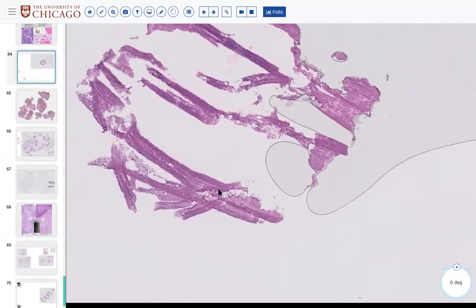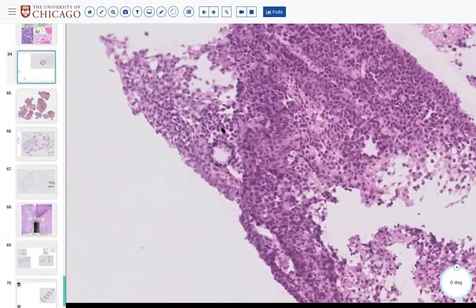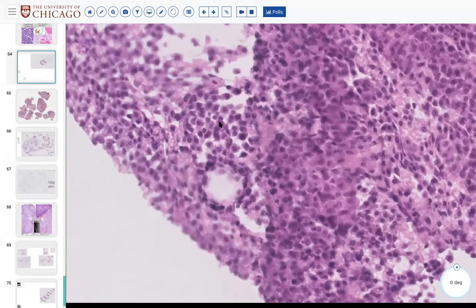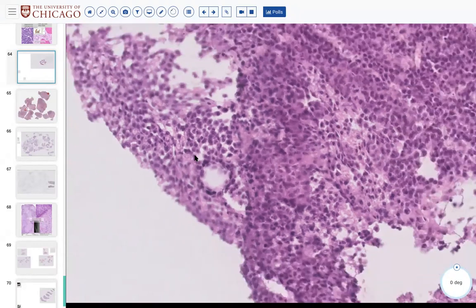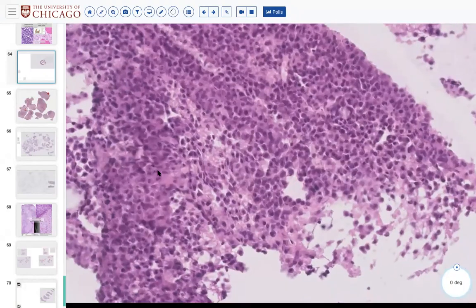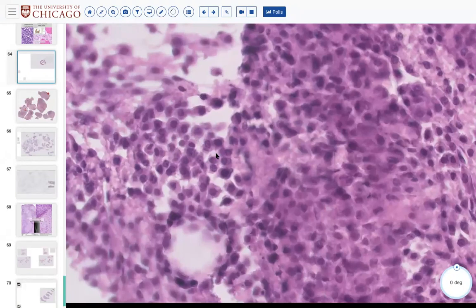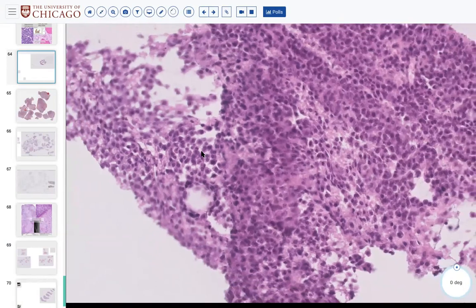So yeah, this is that. I'm sure you'll learn more about that. You have already or will learn more about this in heme than you ever will with me. However, you will see these on the bone service from your orthopedic surgeons. Questions, comments? What you don't really see, in contrast to that eosinophilic granuloma that we saw earlier, is cleaved or folded or grooved nuclei, and you don't really see background inflammatory cells. I don't see neutrophils, I don't see lymphocytes. Okay.